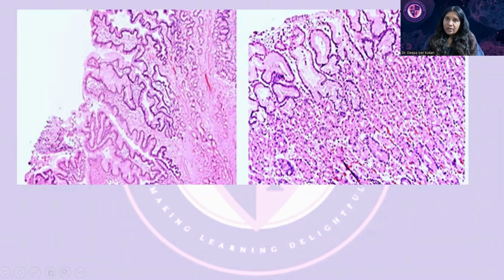One important thing is you should know the differential diagnosis also. The most important pitfall in Barrett's esophagus is a gastric cardia-type mucosa. God save you if the biopsy is taken in the wrong area. The cardia-type mucosa contains mucus-secreting columnar cells, but they lack the true goblet cells. That is very important for you.